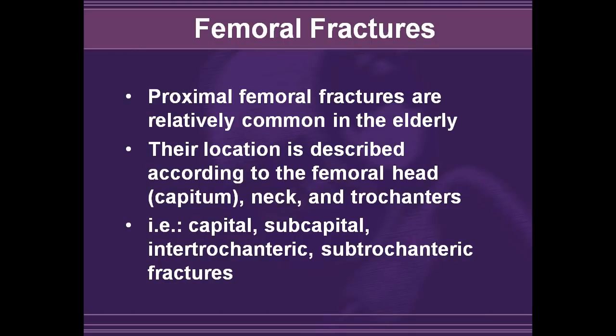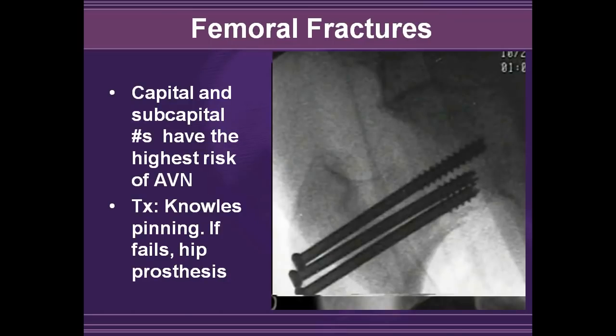Proximal femoral fractures are fairly common in the elderly. Their location is described according to the femoral head, the neck, and the trochanter. There are capital and subcapital fractures, intertrochanteric fractures, subtrochanteric fractures, and of course fractures of the femoral shaft.